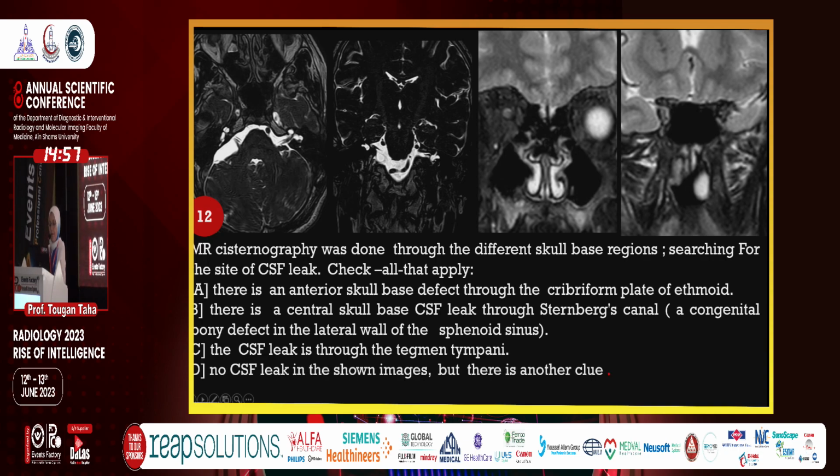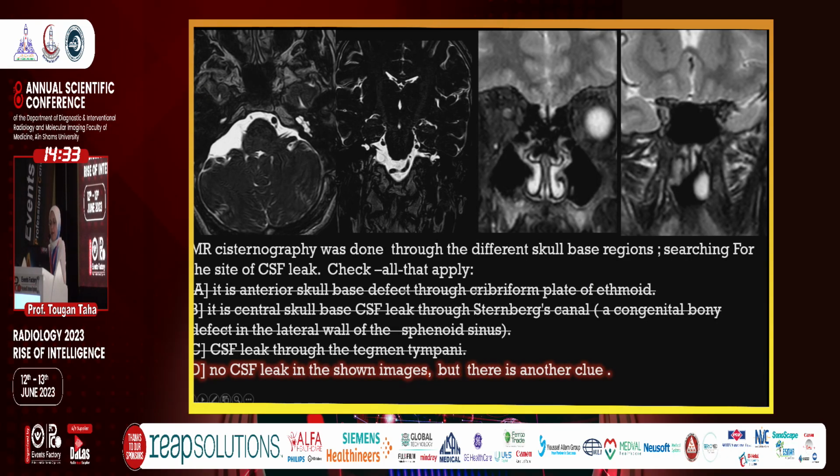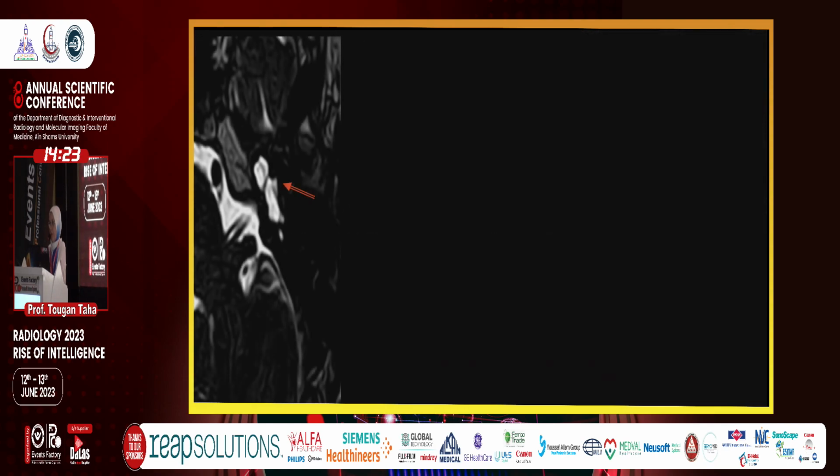There is no CSF leak in the shown images, but there is another clue. Please answer. The correct answer: there is no CSF leak in the shown images, but there is another clue, and here is the clue. Look at the magnified views.